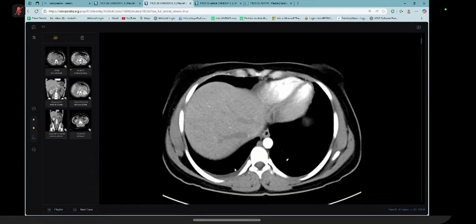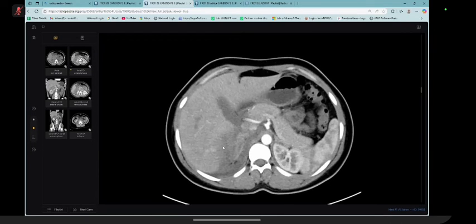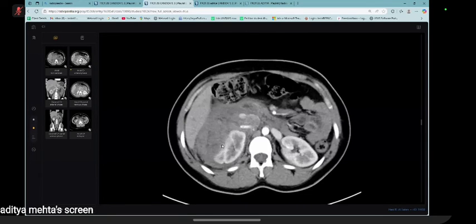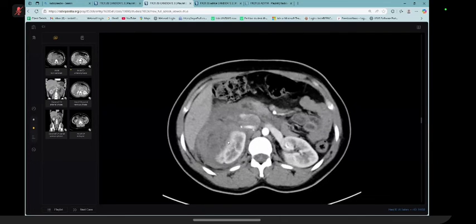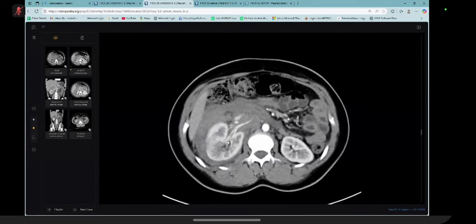Perfect. Another thing which you could see, not in this case, is that there is a checklist for every case. For this kind of case, you can ask for a lung window, check for any lymphangioleiomyomatosis. Sometimes there may be a fatty, low density pleural effusion, that could be a chylous pleural effusion. And as you said, tuberous sclerosis. So here the keywords are acute finding, safety finding is bleeding and fat. So angiomyolipoma, whether it is increasing or not, if it is large in amount, you need to flag it. Any bleeding vessels, for that the interventional radiology team, which you have also conveyed.